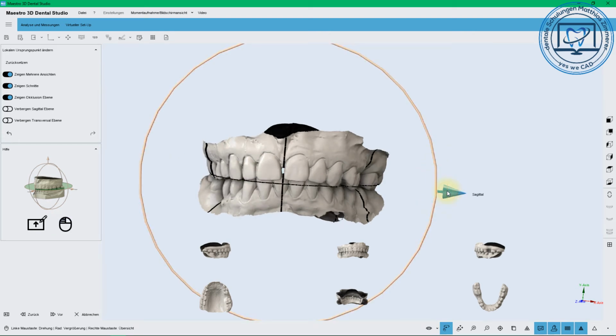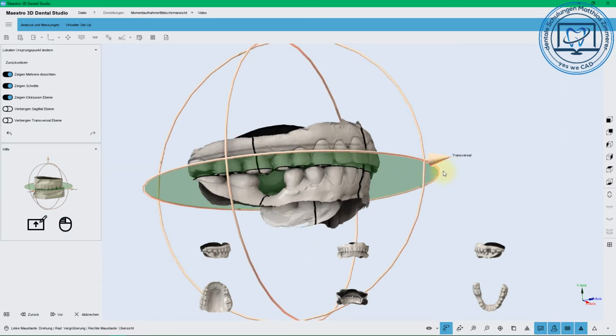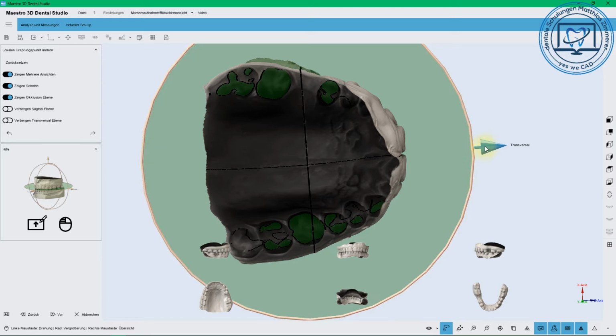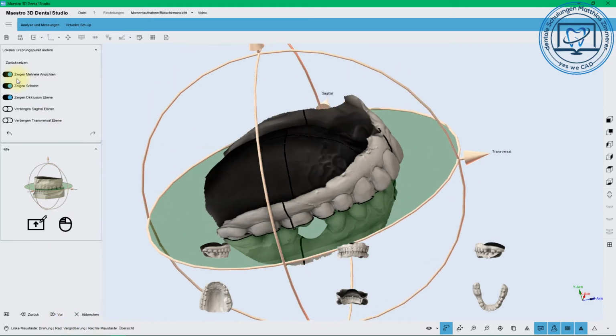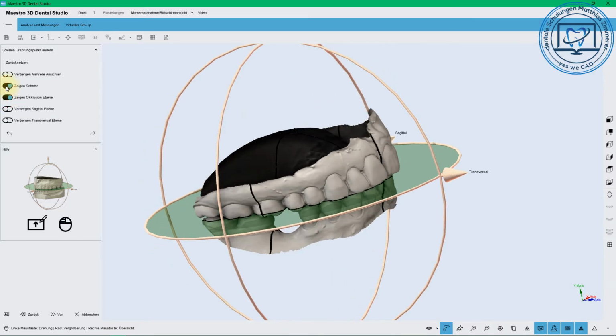Once you have done this, the best is occlusion in the virtual articulation, but there is no virtual articulator available at the moment. In the mid of the 6, sagittal. Look at the transversal.